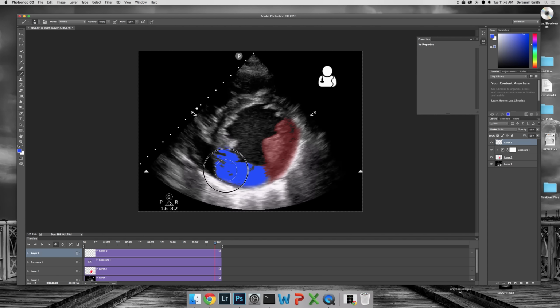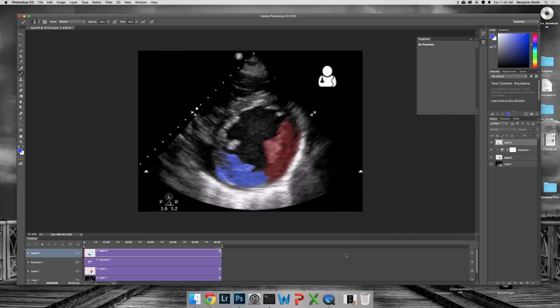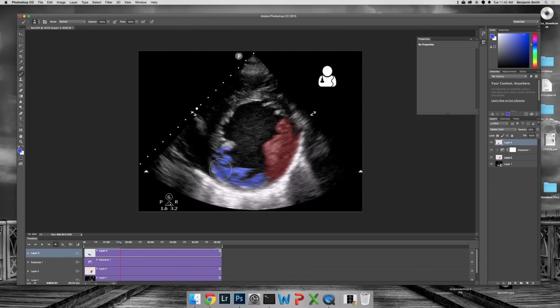As you see, it looks really kind of crummy right now because we forgot to put our opacity back. So we'll put our opacity back to 50% or so here, and then hit the space bar, and you'll see how it looks. It's starting to just colorize the myocardium, but you can see actually we're starting to lose part of it here. If you look right here, we're losing color, and right there.